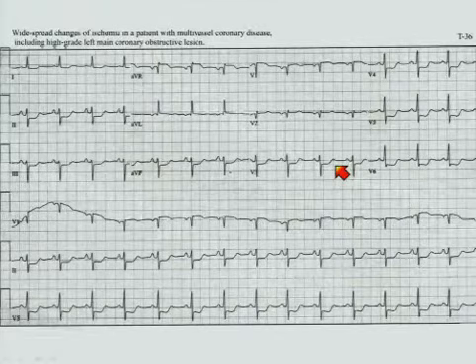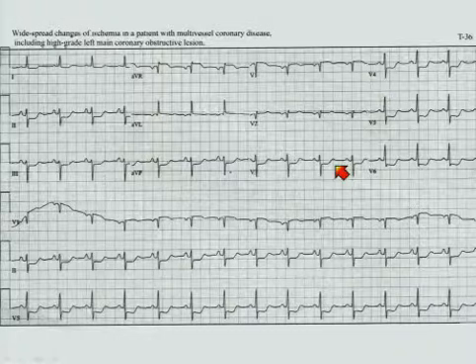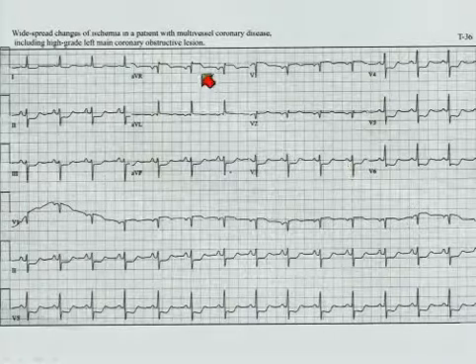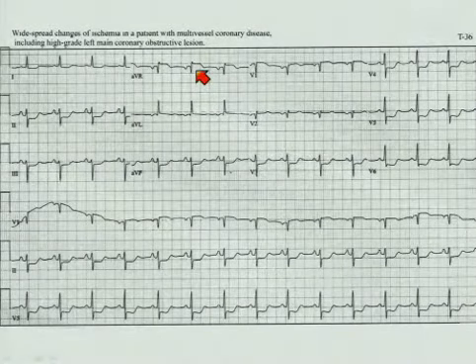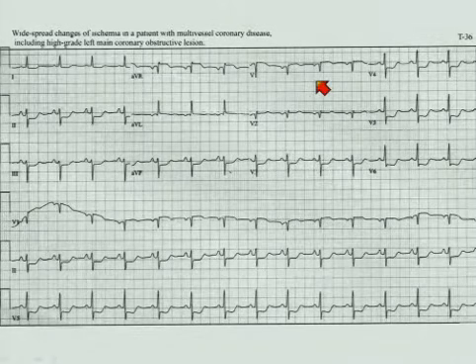Here's another pattern that I'm sure you know readily how to recognize in a patient having chest pain. You'll notice, first of all, that there is diffuse ST depression, indicating ischemia, and pretty dramatic, more than 1 to 2 millimeters. But there also is ST elevation in AVR, and the ST elevation in AVR is greater than the elevation in V1.